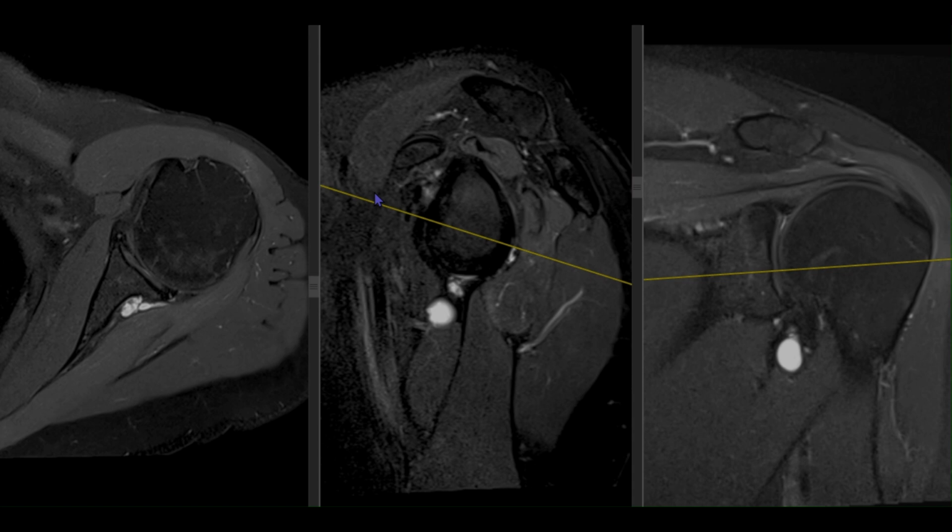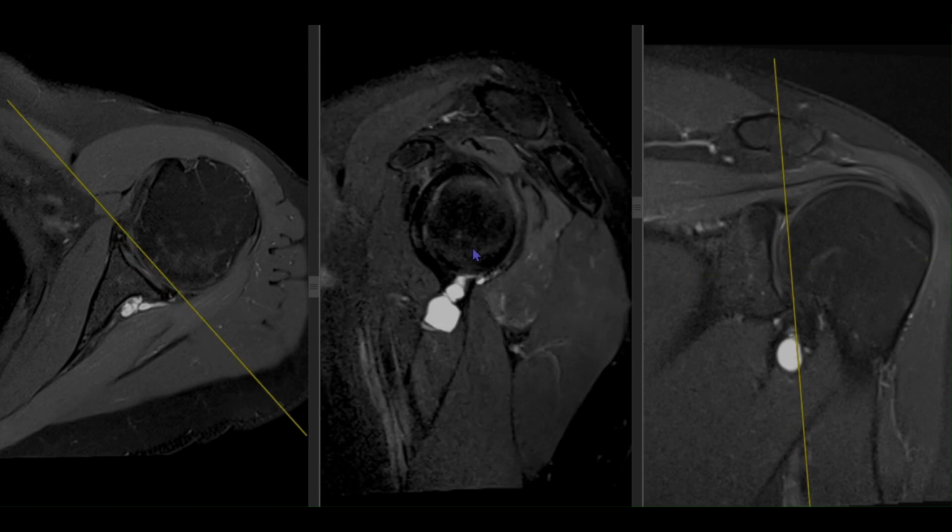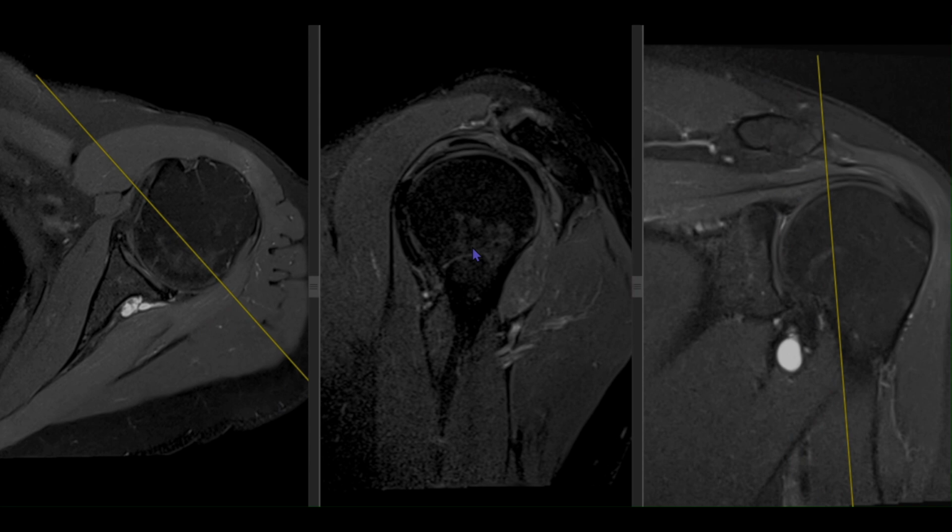So that is uplifting his arm, that is lifting his arm above the head, and this is clinically called as drop arm. For that, he has been referred for an MRI where they are suspecting some kind of neurological complaints. So we'll go through this MRI step by step. First, we will start with evaluation of the rotator cuff.